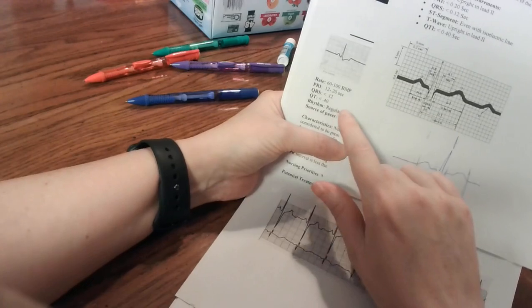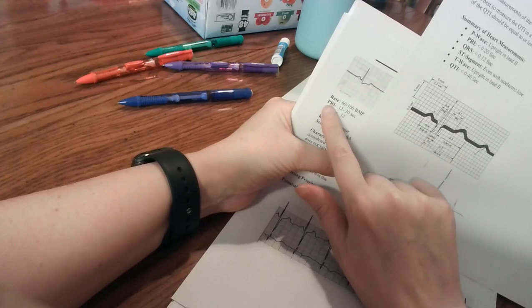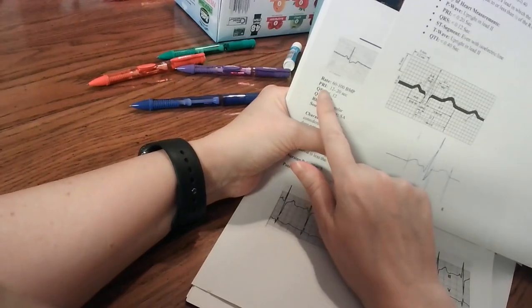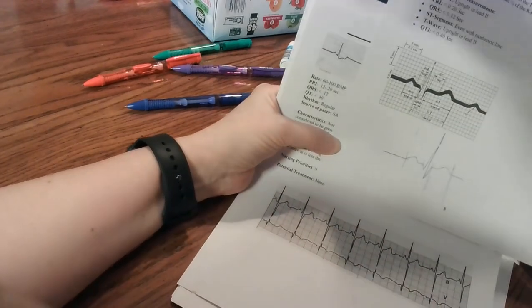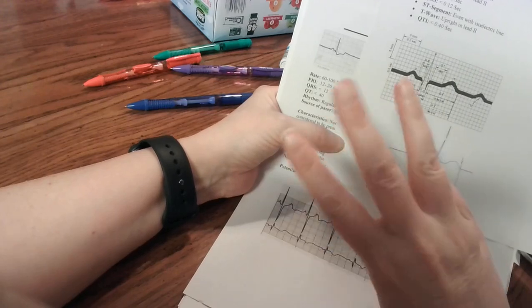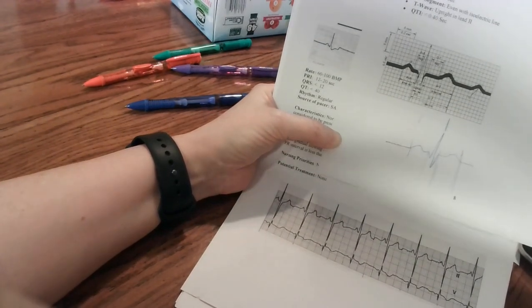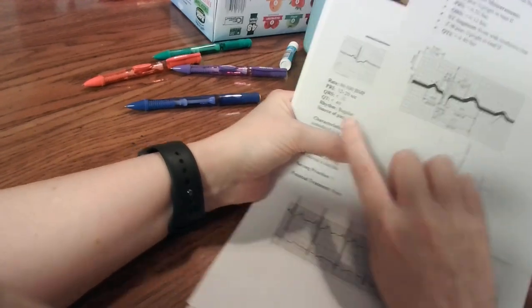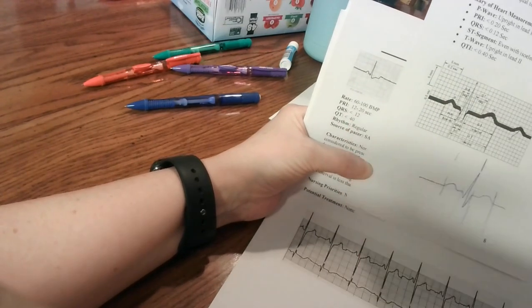I adjusted here because the times that you really need to know are, first, the PR interval. I normally don't see it called PRI. It's just called PR interval. And that's from there to there. It needs to be 0.12 to 0.2. And remember, 0.2 is one big box, so 5 small boxes. So normal is 0.12, which is 3 boxes, to 5. If it's shorter than that, then you're going to say there's a short PR interval, and if it's longer than 0.2, then long PR interval, which both mean different things. QRS is from there to there, and the normal for that is less than 0.12. So it should always be less than 3 boxes to be normal.